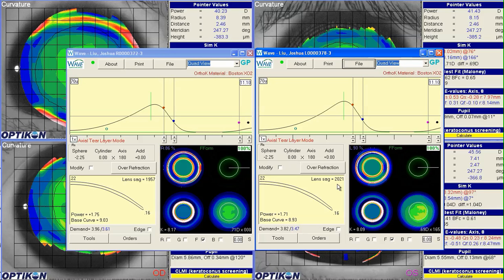So again, I'd maybe just observe the right eye and see what's going on there on follow-up. In the left eye, I would go ahead and just build in the 3/4 of the diopter, so our new target will be about 250, maybe just a little bit under 250. And we can fine-tune some of these meridians.